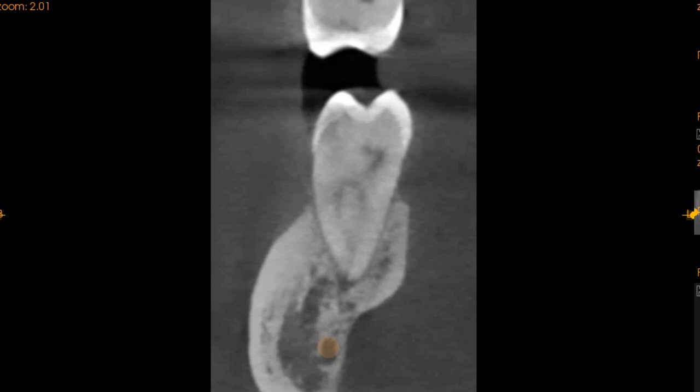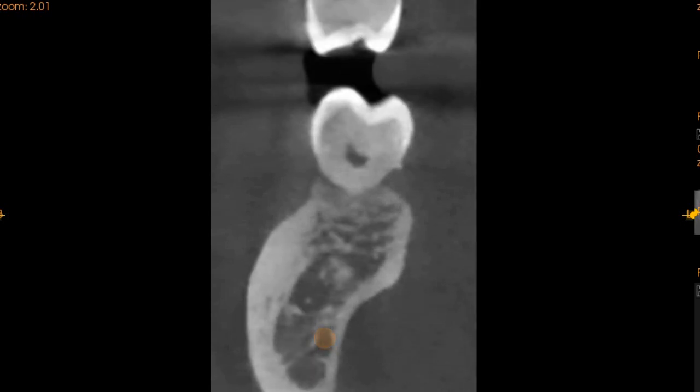Moving to the distal aspect, this is where the cavity is. The cavity is in very close proximity to the nerve at the distal aspect. If we move to the distal root aspect, we will be able to see that the distal root is quite significantly close. Now, the cavity is invading into the nerve space on the distal aspect, which can be seen. The distal root is single, and the canal it contains is single as well. The estimated working length is also 20 millimeters in the distal root.